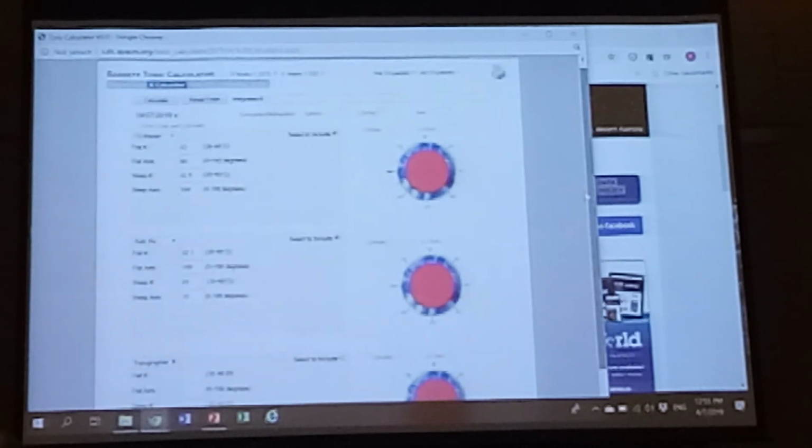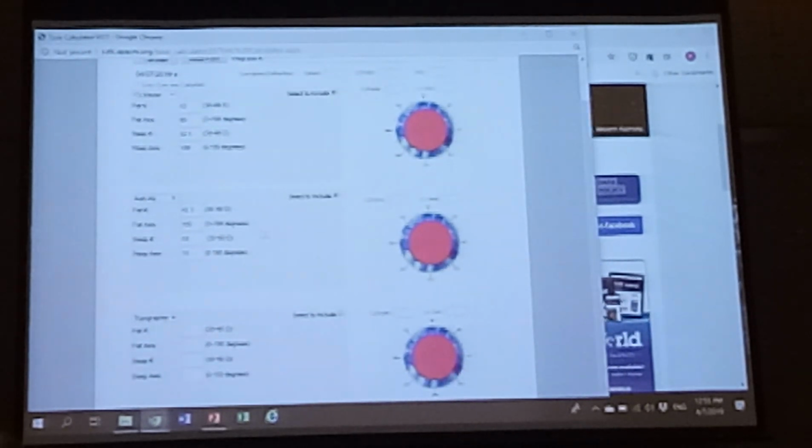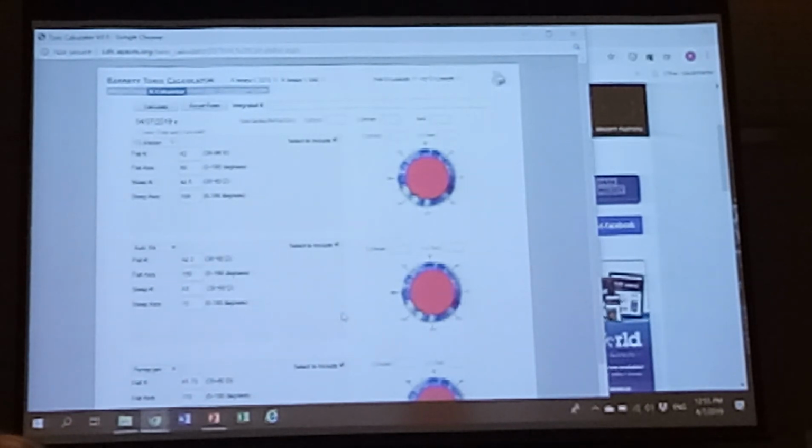This is for this one, which is a Pentacam, my third set of data. So you will call it 41.75 and 110. Say 40.5 and 20. Select it. So you can see I've input three sets of K data and selected to include all of them.